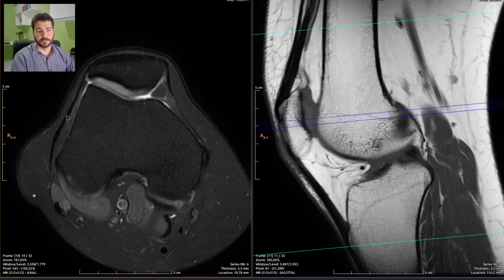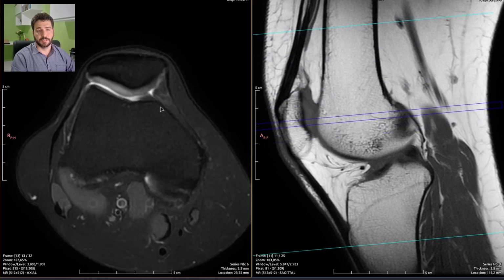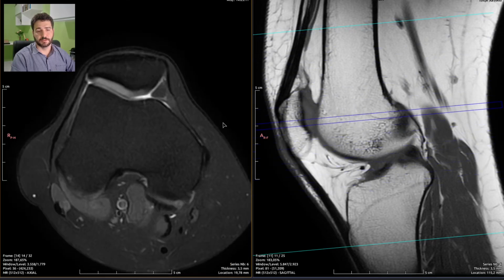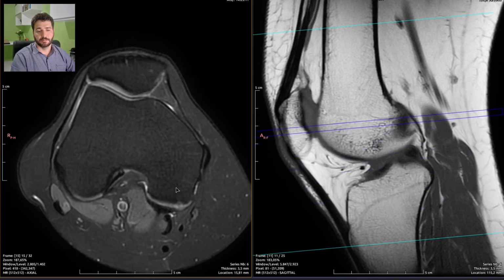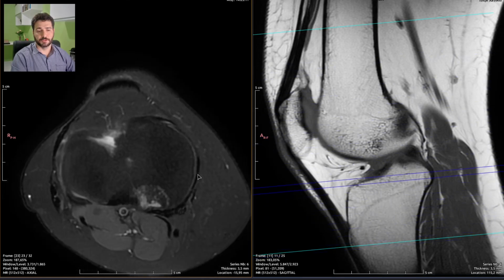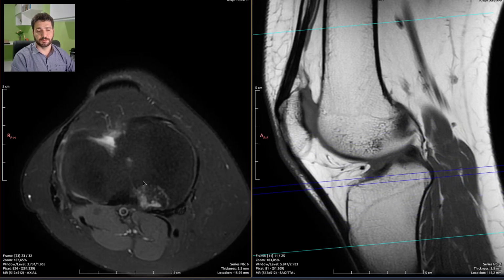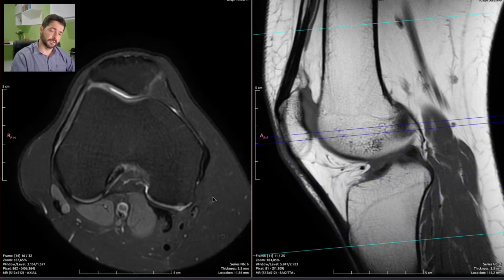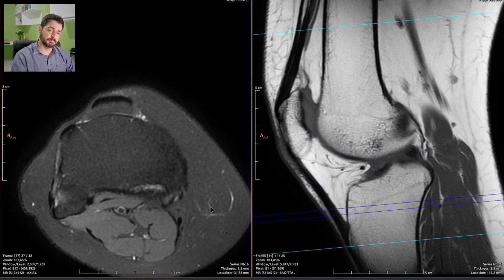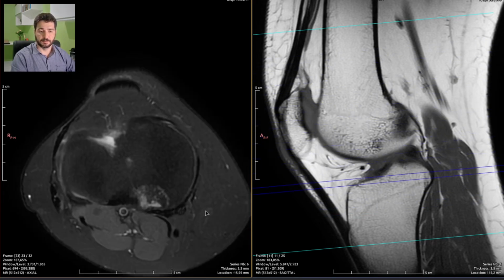Patellar ligaments, retinaculum are fine. The cartilage is fine. It is really just a mild, very tiny, very small articular effusion, and this incomplete fracture on the tibia, on the medial and posterior aspect of the tibia. This is really an easy case, not a common case. This isn't really a common feature.